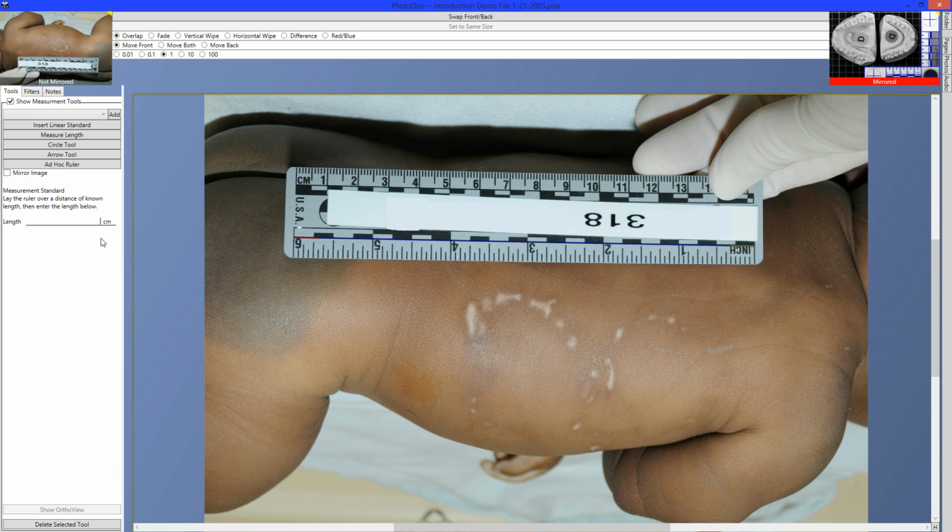You can tell me that it's 6, hit U to make it inches, tell me that it's 6 inches long, and now, if you want to measure how long something is, you can go like this, and you can go like this, and it's not all that bad. It's making the best of a bad situation, but at least it's more accurate than holding little pieces of paper up at the screen to try and measure things.